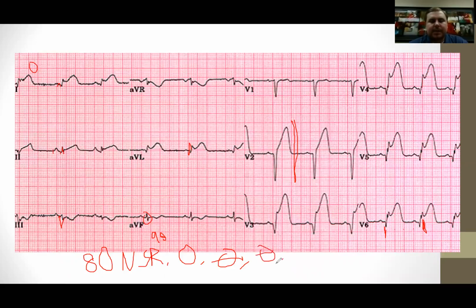And then finally we get to ischemia. You just have to determine what way you like to look for ST deviations. So I'm going to go with the inferior leads first. There's elevation here. There's depression in 3. There's depression in aVF. Look at the high lateral: I have elevation, elevation, and then my V leads, I just go in order V1 through V6. Isoelectric, ST elevation, clearly, sorry, it's out here.